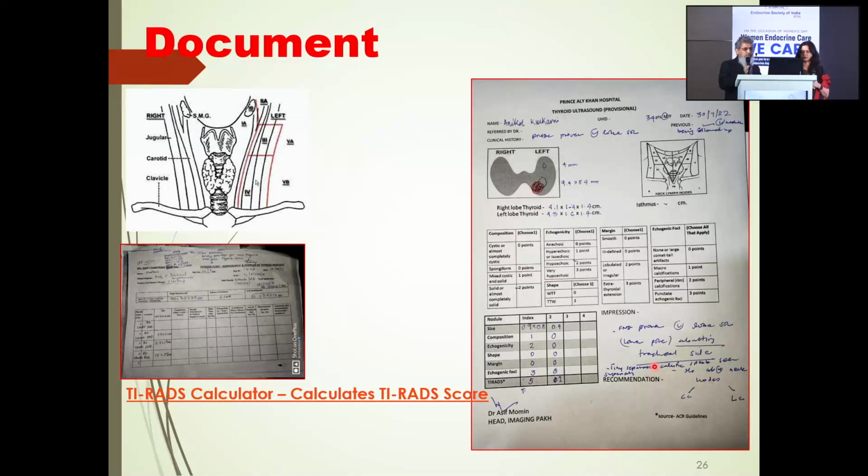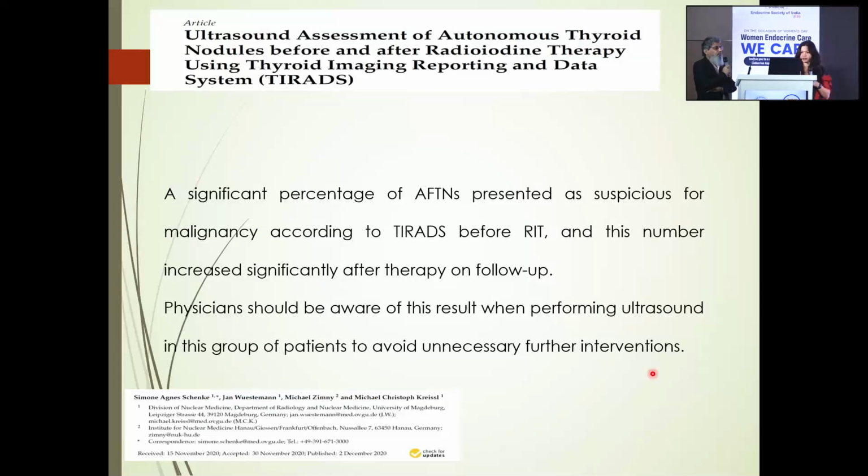It's not a rule that you have to use, but the recommendation will also sort out one more problem, which is knowing what to do with a particular TIRADS 3 nodule over a period of time: 1 year, 3 years, 5 years. These guidelines come from this recommendation, because it is given in the format which we write here. This is very nice for the patient to understand, and for the clinician as well. So it's very important that we are very sure that the TIRADS has been done correctly for the patient.